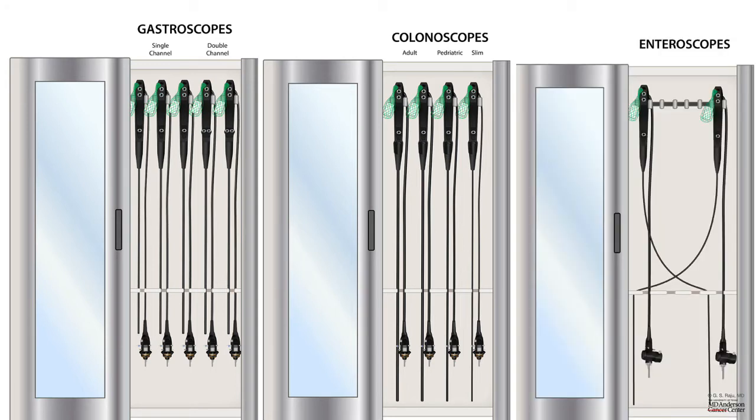As you can see, there is a difference in the length of the insertion tube between the gastroscopes and colonoscopes, and between the colonoscopes and the enteroscopes. You also notice that there is a difference in the caliber of the scope. So we will go into the details as we discuss it next.